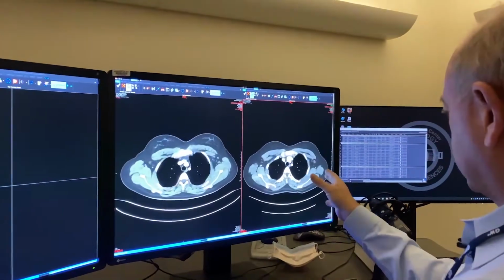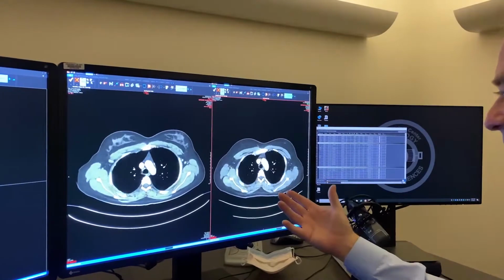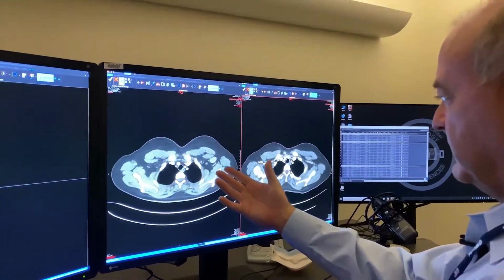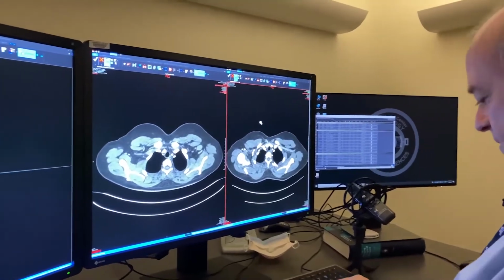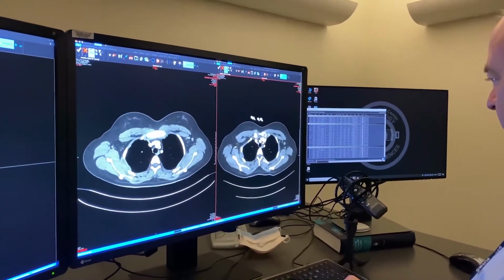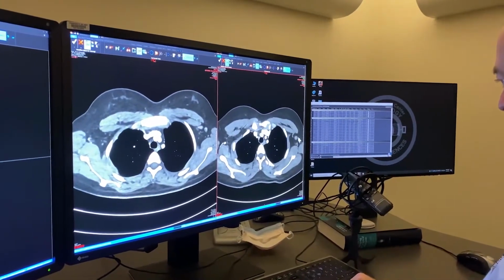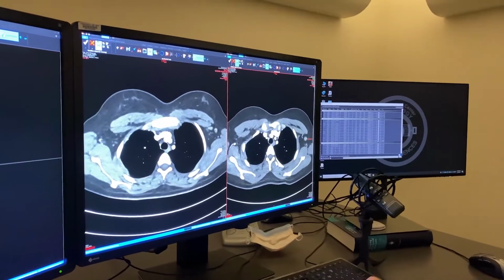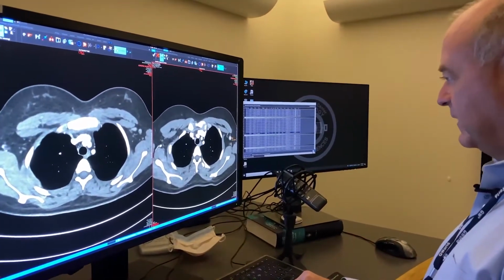Now, I'd like to show this adenopathy here, that they've given him a therapy where the adenopathy is much smaller. So this is in the axilla area where you can palpate. And so then a radiology preprocessor will go in and say, okay, Dr. Folio wants this measured. And there is some automation to be able to do this, but I'll show you here what's going to happen. So we use 2 diameter measurements.